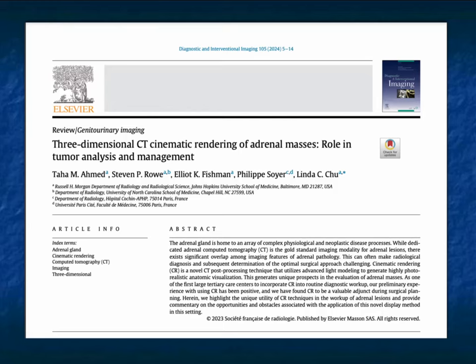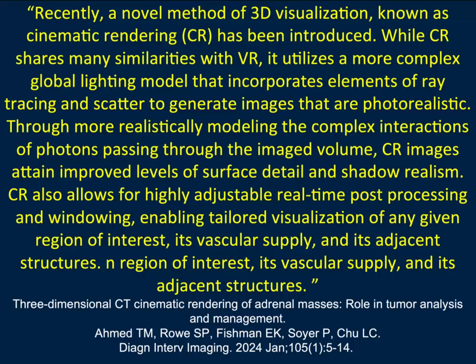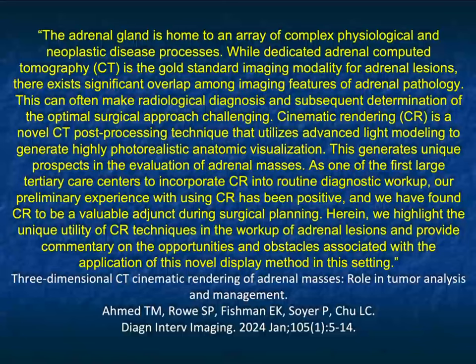Now, in terms of imaging, I think one of the things we'll speak about is 3D imaging in the evaluation of adrenal lesions, particularly with cinematic rendering. We like to talk about new things in terms of imaging. I think particularly in larger lesions, the 3D can be valuable localizing the lesion to the adrenal. It can be valuable in looking at interfaces, looking at texture. It also can be valuable if you're planning surgery.